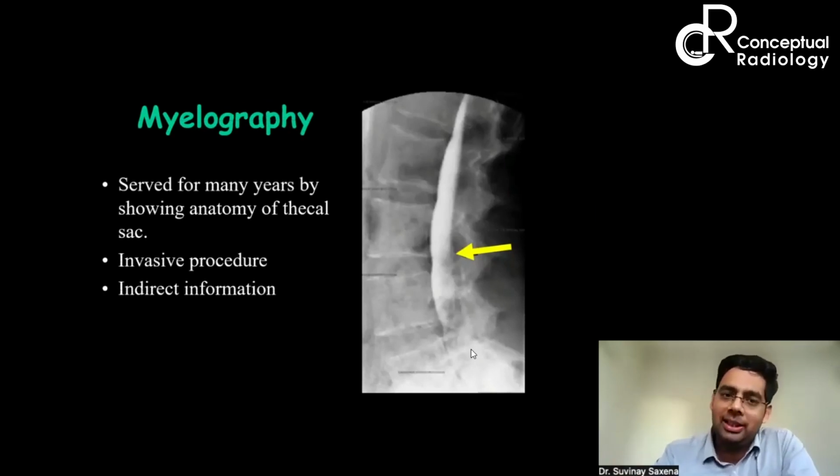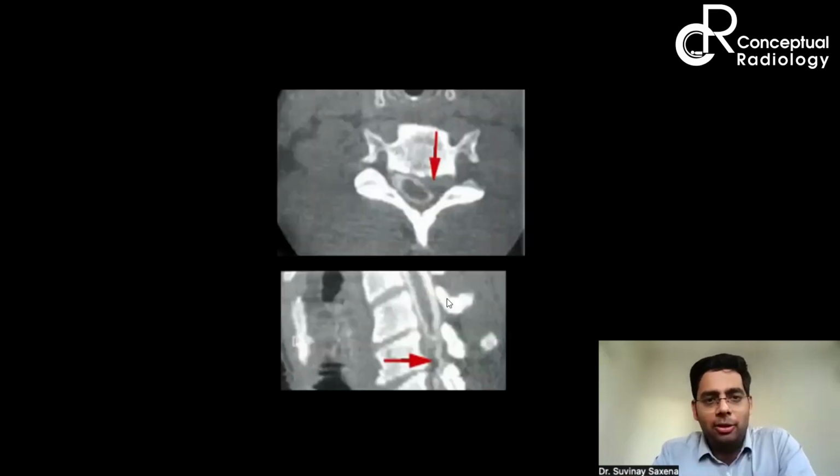माइलोग्राफी पहले बहुत करते थे. It used to be a conventional myelography. Exam में spotters भी होते थे in which they used to inject directly intrathecally using C-arm and see the disc bulging herniations. अभी ये नहीं करते हैं. अब this is almost obsolete.